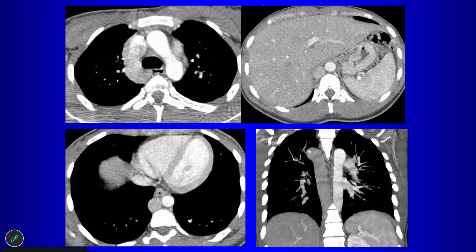How? That didn't keep you up at night when you realized that the intrahepatic IVC is missing? It didn't strike you? What happens to the hepatic veins? Oh my gosh, where do they go? So where do they go? They drain into the SVC. They drain to the SVC?